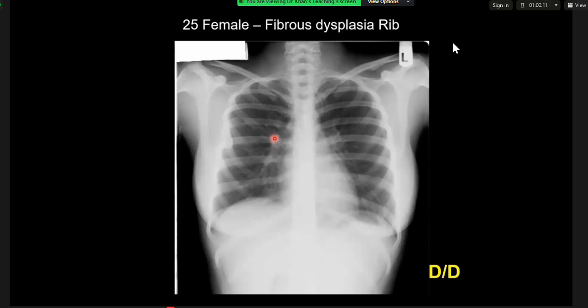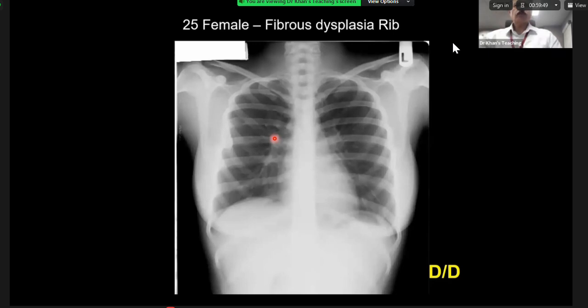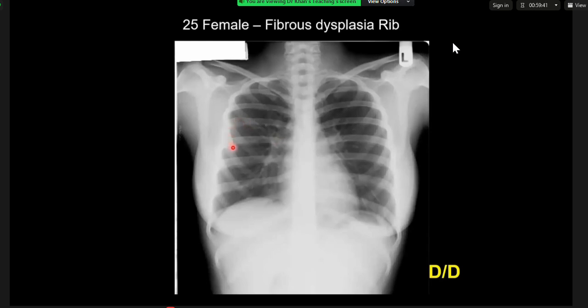So as I mentioned, there's bony expansion, but it has well-defined borders, and actually looks predominantly sclerotic, but I think partly that's due to the fact that it's en face to the X-ray beam. It's difficult to describe its internal matrix, although it looks quite uniform. Right. Oh no, sorry, I'm looking at the wrong thing. Okay, no, so it looks lytic. It looks lytic with thinned cortices, well-defined borders, no bony destruction, and mild expansion.